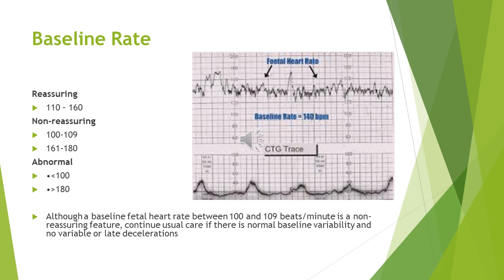However, you need to take care about what the baseline was before the time you are interpreting the CTG. That's why CTG is just a paper, and don't interpret based on the piece of paper in front of you. In other words, don't take a snapshot of the time. You have to interpret from the start of CTG monitoring, because we have a rising baseline or a dropping baseline, which is very serious and can be missed easily.